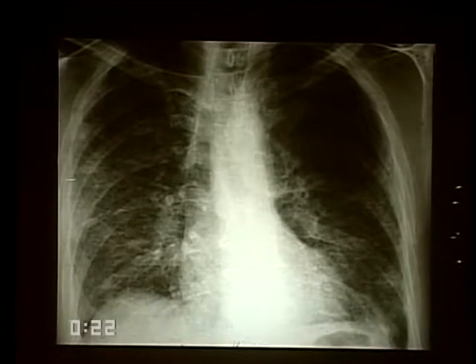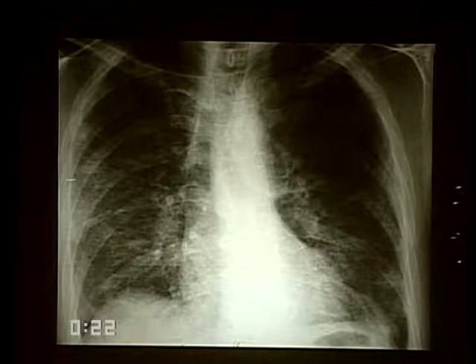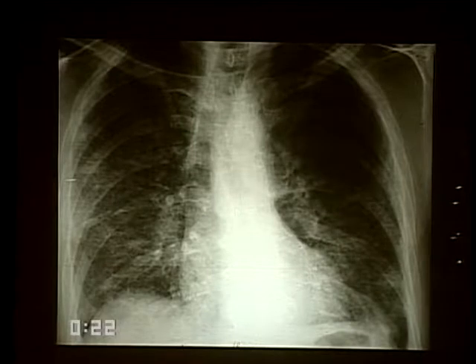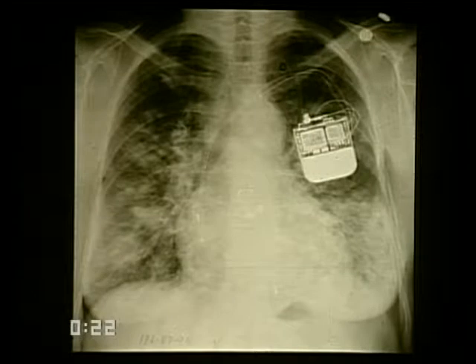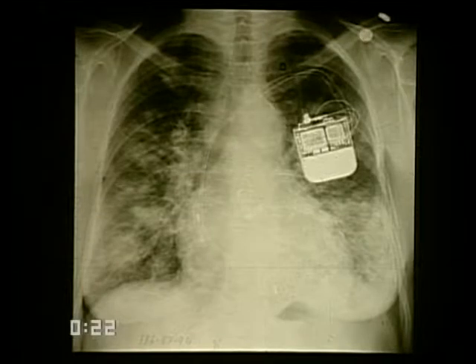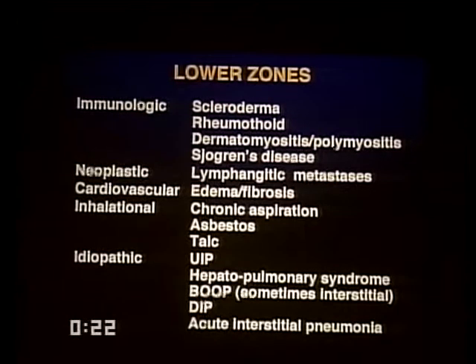Drugs, a whole variety of drugs, extending from aspirin to chemotherapeutic drugs, may produce interstitial lung disease. This one happens to be one of the commonest. It's bleomycin. There's an immediate tip-off on this as to what the drug is. This is the antiarrhythmic drug amiodarone, which can produce not only interstitial disease but occasionally patchy airspace disease. And since it typically will afflict individuals with heart failure, the pattern can be exceedingly confusing radiologically.